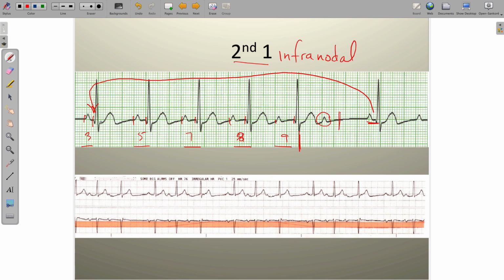and when it starts to fall out of that, it does everything it can to try to reestablish that sequence. So the PR interval has elongated to the point where now there's a sinus beat, and it never makes it down to the level of the ventricles. It's blocked from doing so as the AV node and the infranodal area is reset. And then it does reset to a normal PR interval. And if we were allowed to see the rest of this strip, this would continue to happen.